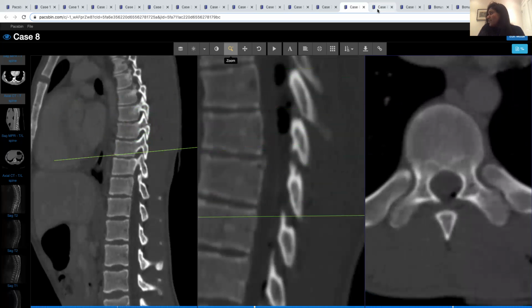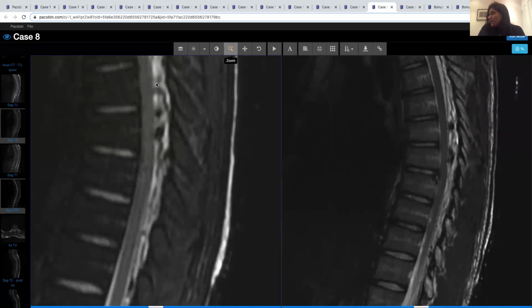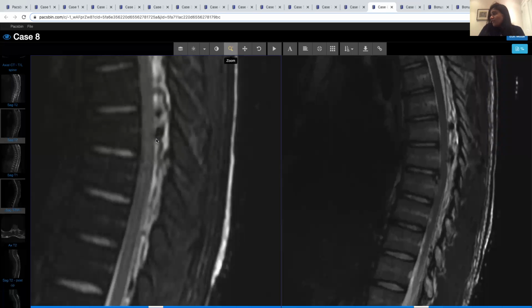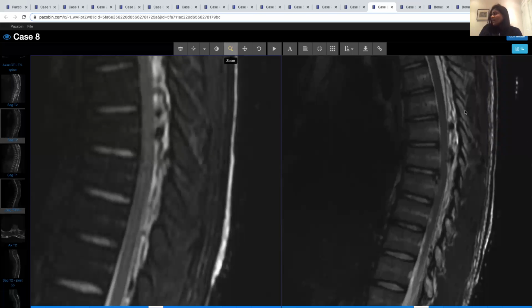So the patient had an MR before they went to exploration, and we can see that there's an expansion of the dorsal epidural space. There's gas locules as evidenced by these small foci of signal dropout. There's hematoma within that dorsal epidural canal. I think it's very hard to say whether there is injury here. I think there probably is.